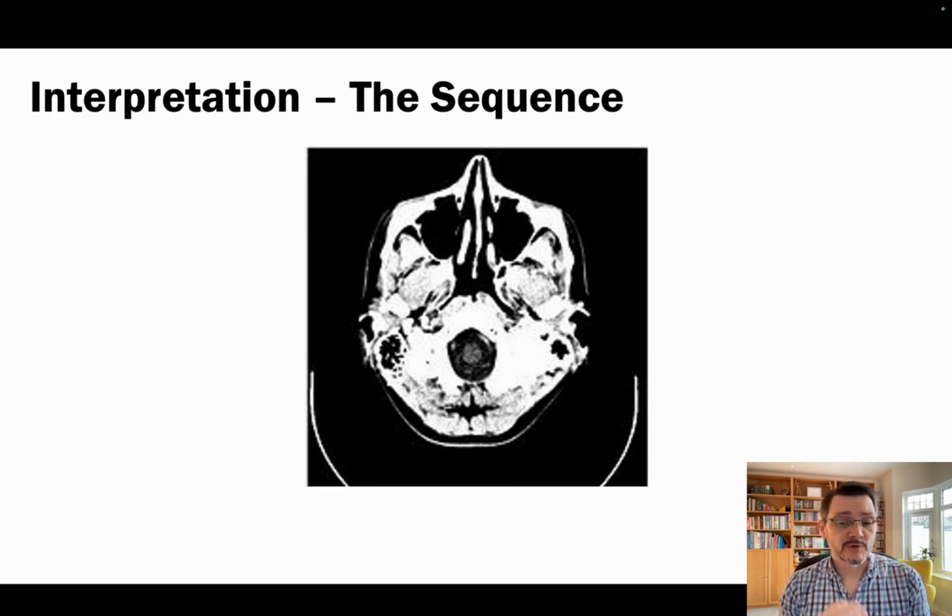Now, what we're going to be doing is travelling from here upwards, but point of note is that the image is actually taken in that sort of angulation because we're trying to avoid as much as possible the delicate organs. So what you'll see is that we'll be travelling up in that direction, and each CT scan is taken at a slightly different angle depending on the individual's head shape, so there will be some variation from person to person, but grossly these are relatively similar.